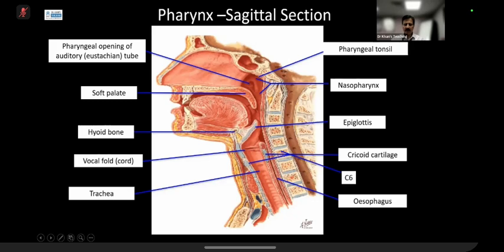And this is the hyoid bone. Now, this is the epiglottis. And from here till here, this is the cricoid cartilage. This is the larynx. Inferior to the level of the oropharynx, from here till here is the hypopharynx. Please remember that the esophagus, anatomy textbooks will tell you, starts at the C6 level. So the hypopharynx or the laryngopharynx is then in continuity with the esophagus.